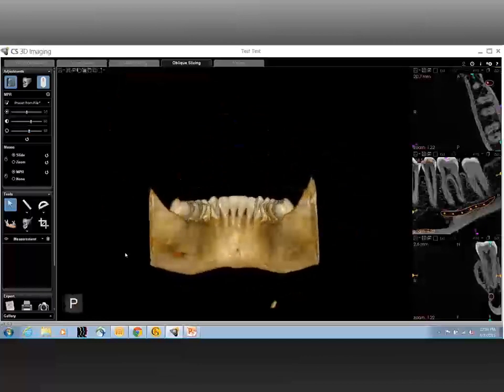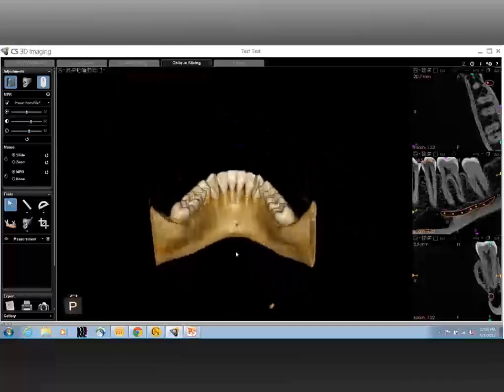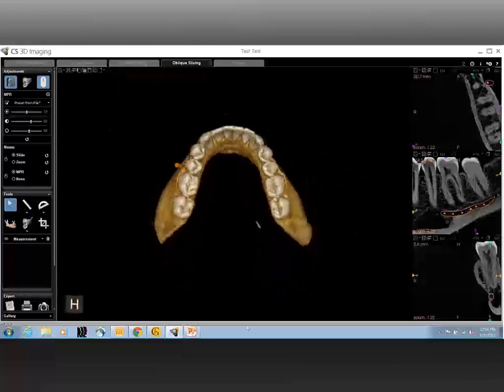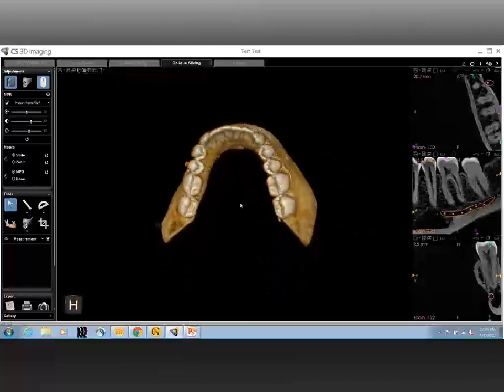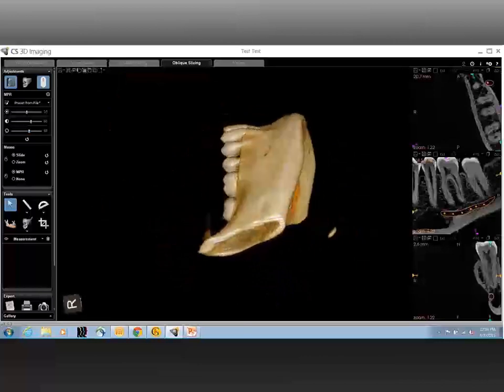Now, calcified lingual tonsils are very commonly visualized. Not a very serious finding unless there's some history to it, but it can also be visualized in a different view. Calcifications in the thyroid can also be visualized.